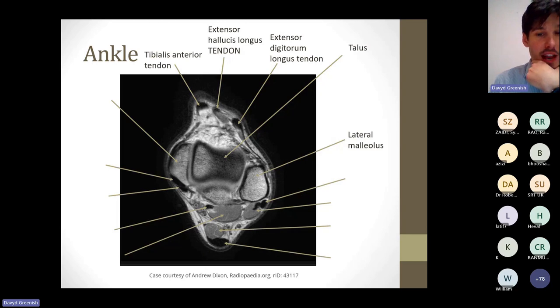So this is getting tough now. We're over the lateral aspect of the ankle and the posterior aspect. Spot on, absolutely spot on. Peroneus longus tendon. Make sure you're saying tendon because it's obviously attached to a muscle higher up. So I would say tendon at that level.